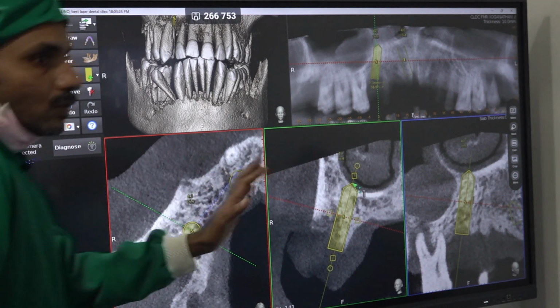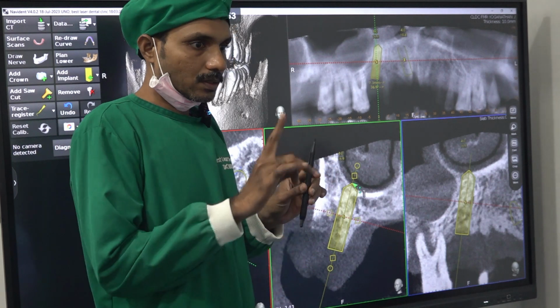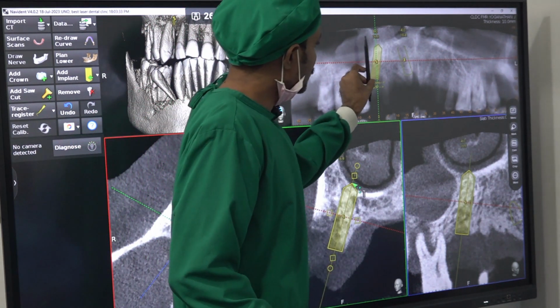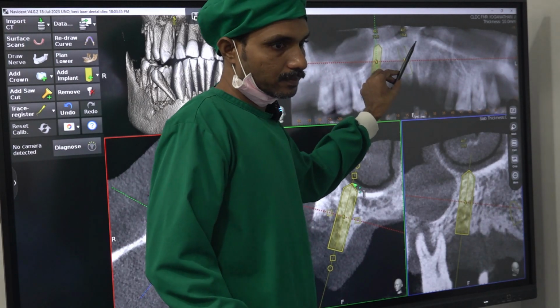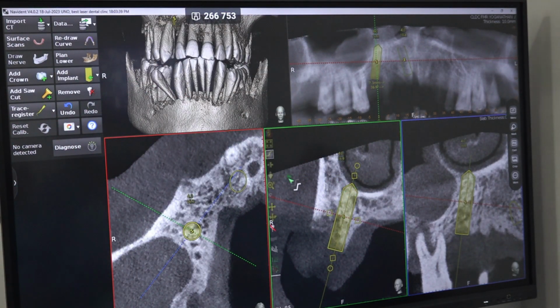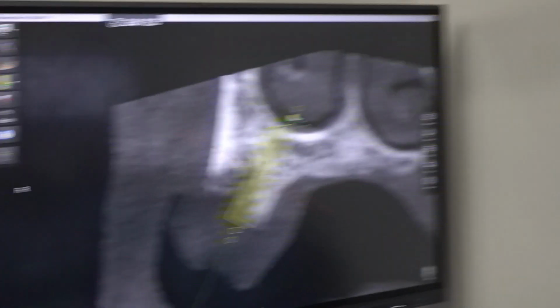Okay. So we know about tilting from 5. But there are 2 styles of tilting. This is mesial tilting. But there is one more tilting that happens in the other dimension. Yes. So in this tilting, you are tilting palatally here.